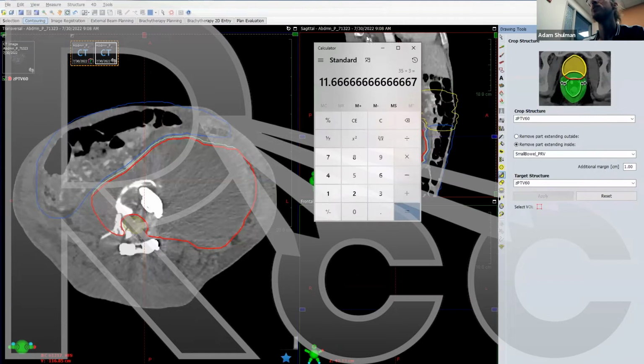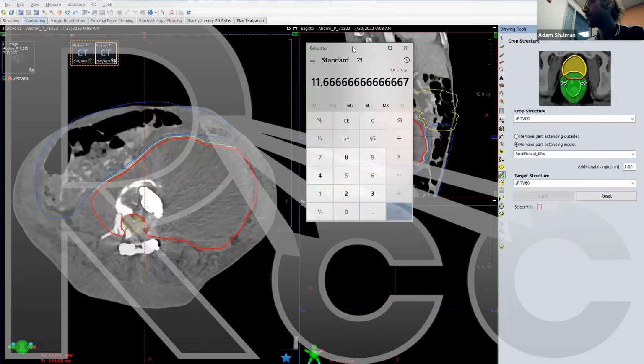So we'll come back here. We just did 40 gray. Remember that was 35% dose fall off. 40 divided by 60, 1 minus that times 100. You get the point. It's 33. But now it's a small organ at risk. So small means 10% per millimeter. So divided by 10, 3.3. So we should, in 3.3 millimeters, go from 60 gray to 40 gray for our spinal cord.